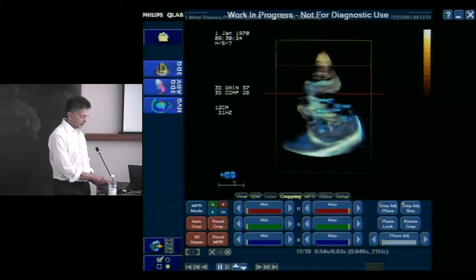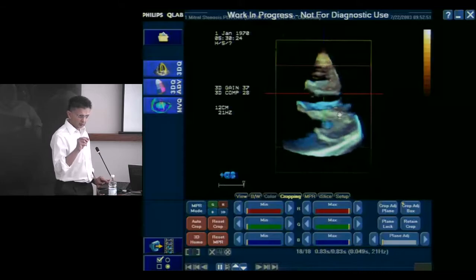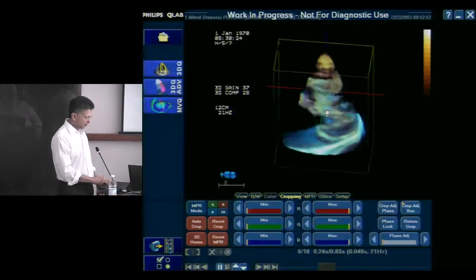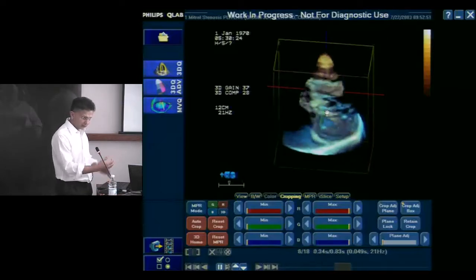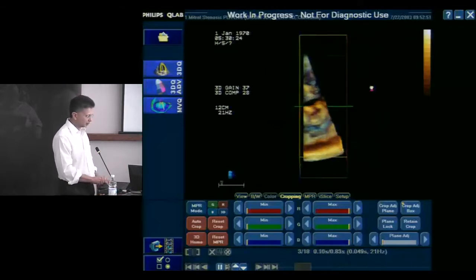So you get a lot of detail. And if you have a surgeon who is planning to go in and do the kind of fine work that is going to be needed in terms of fenestrating this subannular, it's all sort of below the tips of the valve. So they're going to have to go into the left ventricle to work on this mitral valve.